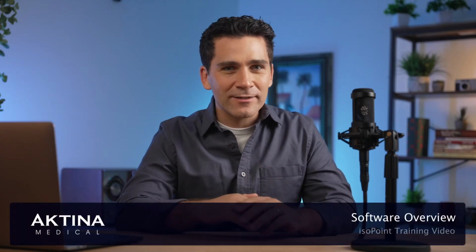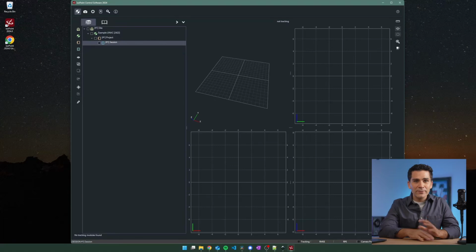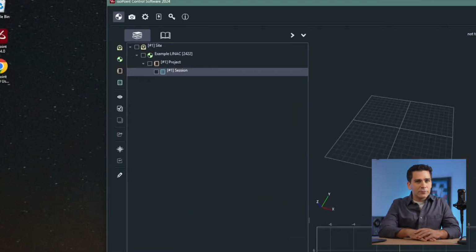I'm Eric with Aktina, and in this video, we'll provide a high-level overview of the functionality of your isoPoint software. Let's dive right in. After starting the isoPoint software, you'll see a row of horizontal buttons along the top, which will be enabled if your software is properly licensed.